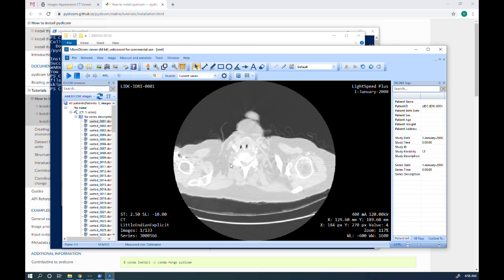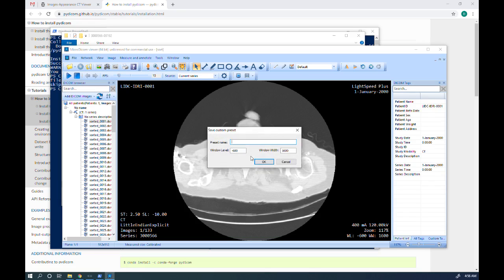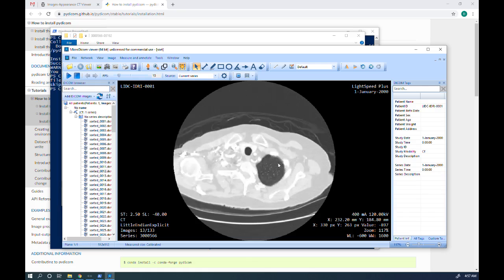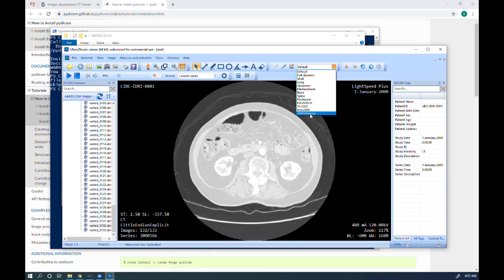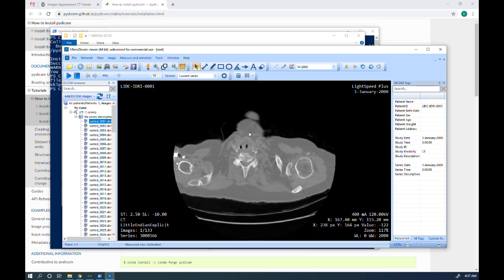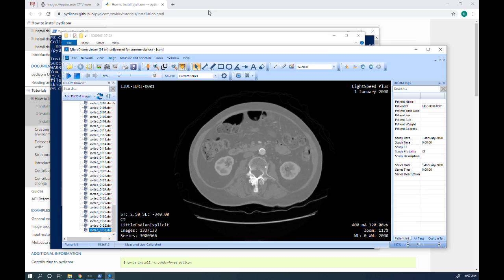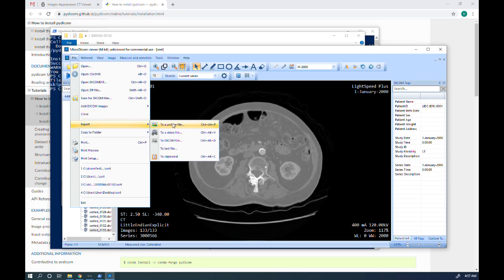Okay, so I'm going to pretend we're exporting this for the viewer to use with windowing. So I'm going to create a new window here that is 2000 HUs wide. So start it at 0, which is the water density, and then we're going to do 2000. So it's going to go all the way down to air, 0 out at water, and then go all the way up to 1000. So let's apply our window. And with micro Dicom, you need to scroll through all of the images to apply the window to each slice before actually exporting.